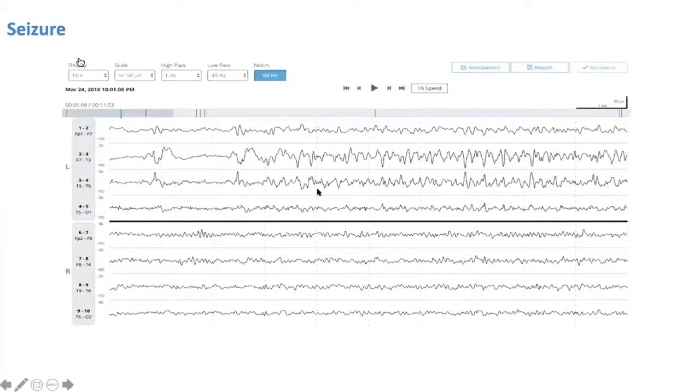So can you comment on why we don't see that very typical sharp and slow wave that happens in the beginning? It kind of becomes so crowded that it gets mixed. You don't see that very sharp and slow. Yeah. So the sharp and slow wave, or spike and slow wave, it's also called, just so everyone knows we're talking about the same thing, is not one phenomenon. It's an abnormal discharge, but the slow wave relates to a correction for that discharge. And the slow wave actually might be the response to the abnormality, normalization.